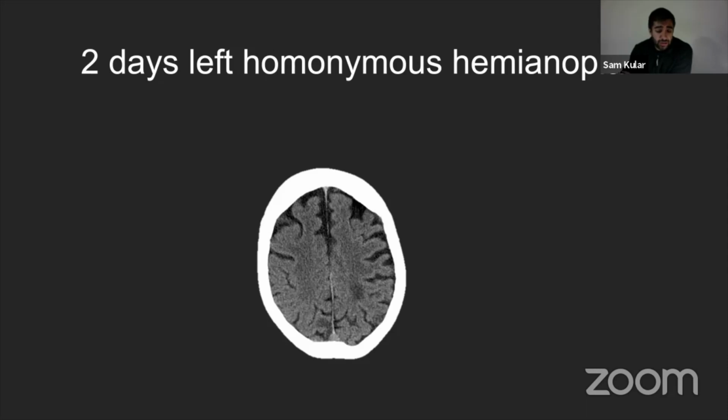This is a long-standing process, essentially like atherosclerosis of the peripheral vascular system. So over time, particularly patients who've got vascular disease will have these low density changes, and they tend to be within the white matter. They don't resemble a stroke because they don't have loss of grey-white differentiation.